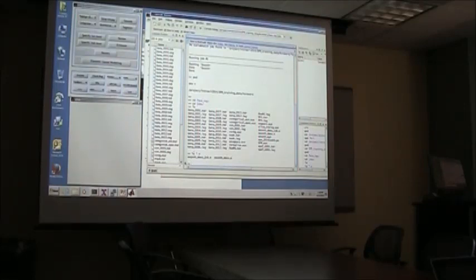So the same file I just used to run in SPM is now saved here as a so-called job file, and another way to run it is to use... this is another alternative way of running that job that I just did before.